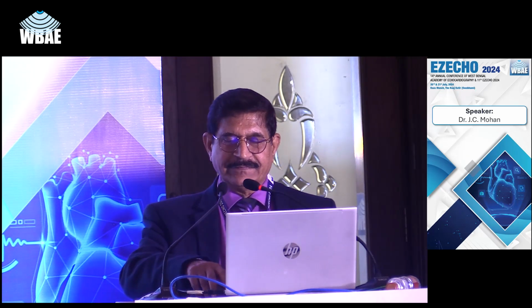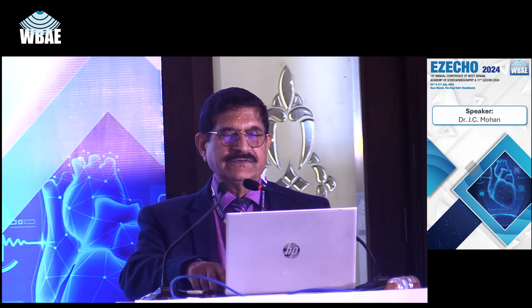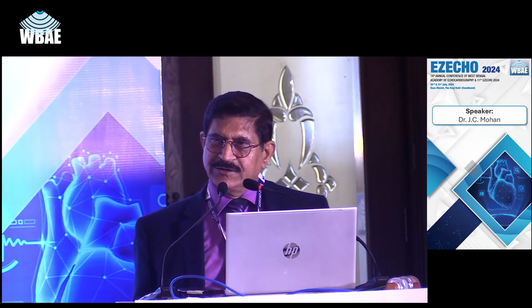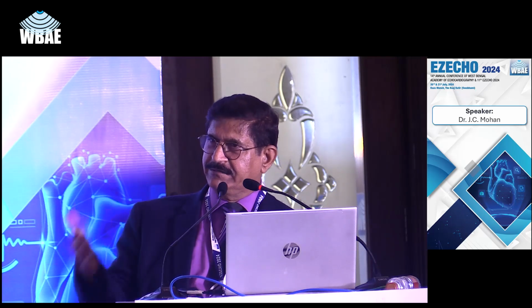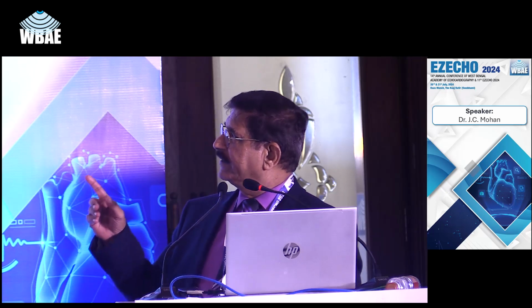So the myocardium is hyper-intense on STIR imaging, and this is perfusion imaging. This we have already discussed, and this is of course the MOLLI sequence for T1, and you would see that T1 values are markedly increased. They are more than 1400 milliseconds, but there is spared subendocardium, ruling out amyloidosis.